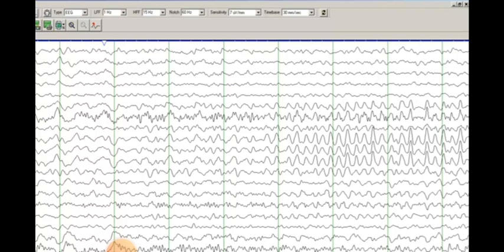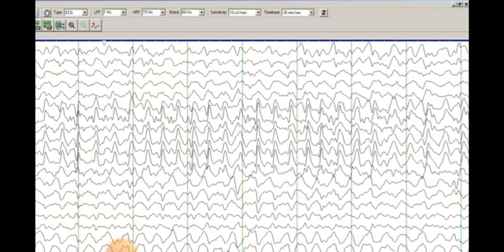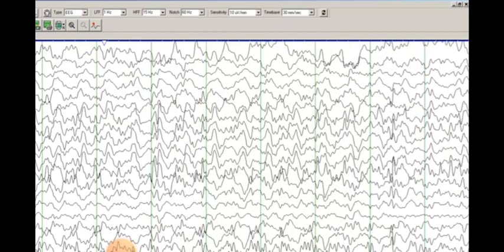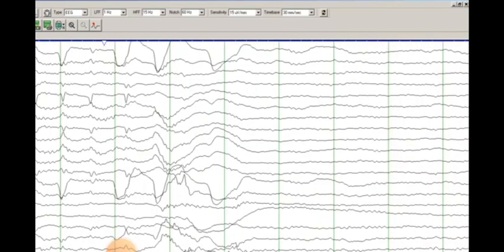So with seizures comes an increase in muscle activity, and that is physical activity leading to an increase in heart rate. There is also a sympathetic drive during the seizures, which can also account for the increased heart rate. And the seizure, you can see, is evolving in the amplitude, and basically now it has involved the other hemisphere as well. I will cut down the gain a bit, and you can see the seizure all the way.